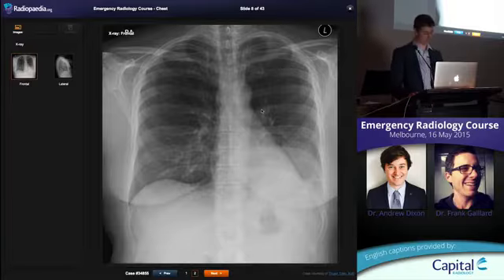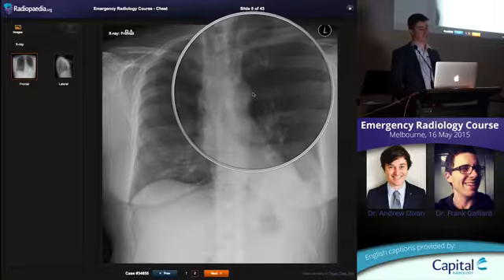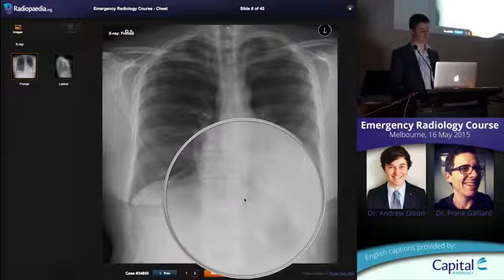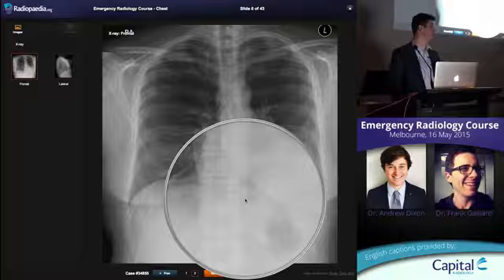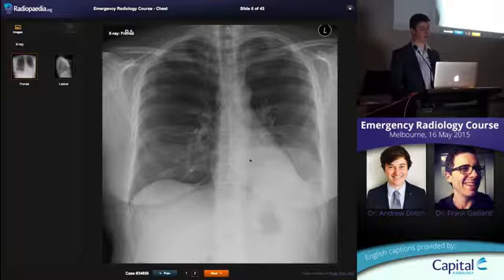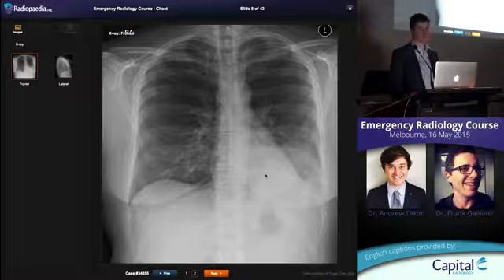And what Nina is referring to is that the aorta is posterior in the chest, okay, and you can see it here outlined all the way down. The lower lobe is of course located posteriorly as well, so you shouldn't be able to see it in a real left lower lobe collapse, but this one, consolidation must be slightly lateral to that margin. Is that what you're wanting to point out? Yeah. So the fact that you can see it means there's not consolidation or collapse throughout the whole of that lower lobe, it's just partial. Okay, so it's more further out, touching the hemidiaphragm.